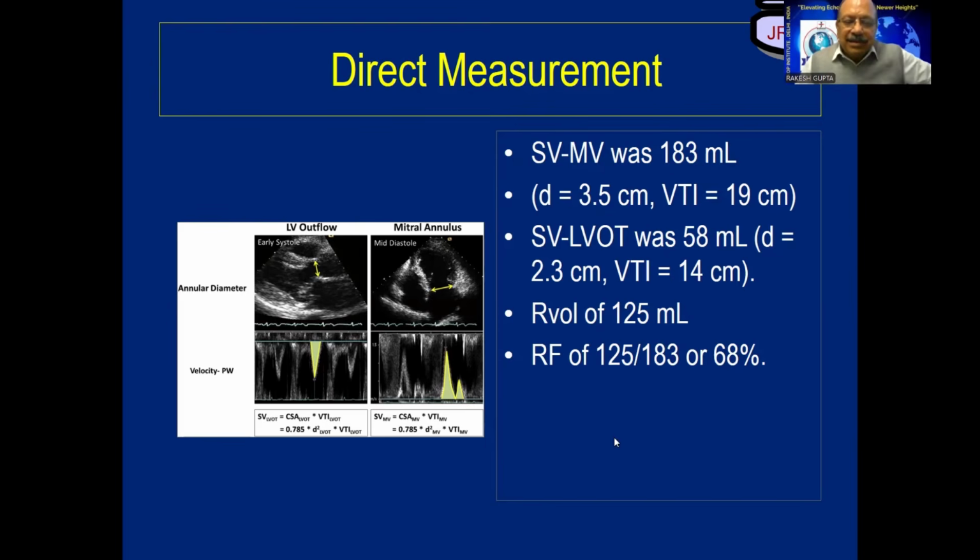So another thing, a very silly question. When we take that recording of 2-3 loops of the cardiac cycle, how do we get that, sir? That recording, like real time, I can see, but to get that recording so that you can scroll through systole and diastole. This is a button on the machine which helps you do that. You bring back that loop, freeze it, and then scroll by trackball.